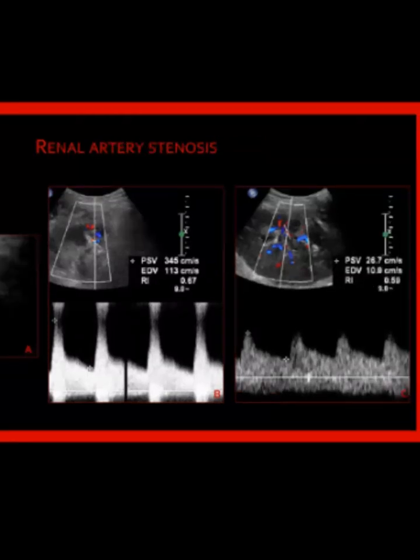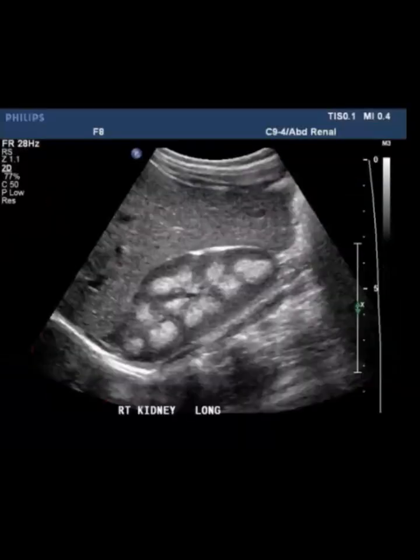Okay, next I will tell you. What is this, brother? How to agree with you, Dr. Aswar? Calcifications. Calcification. Yes, you can see here. Okay, so what is the terminology for this?